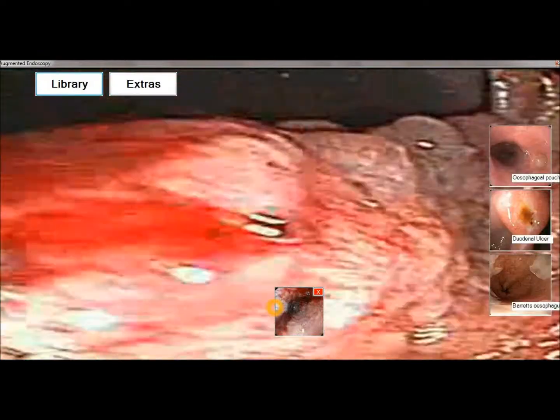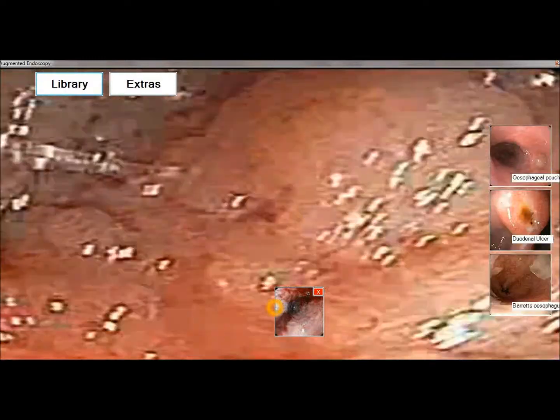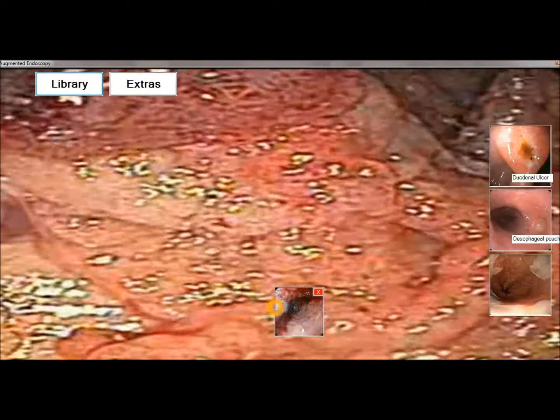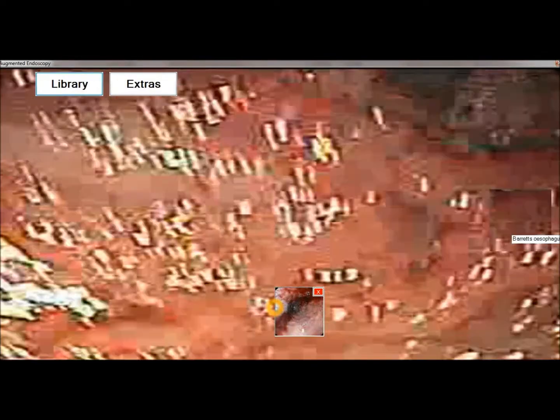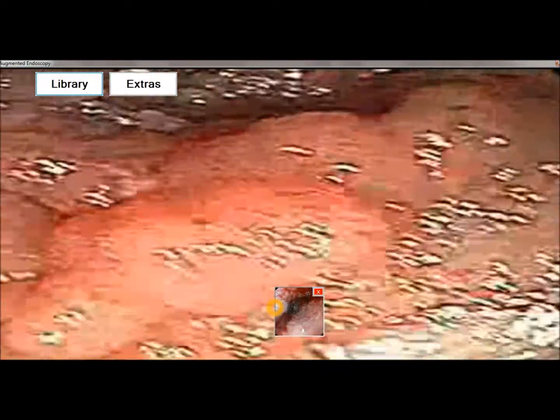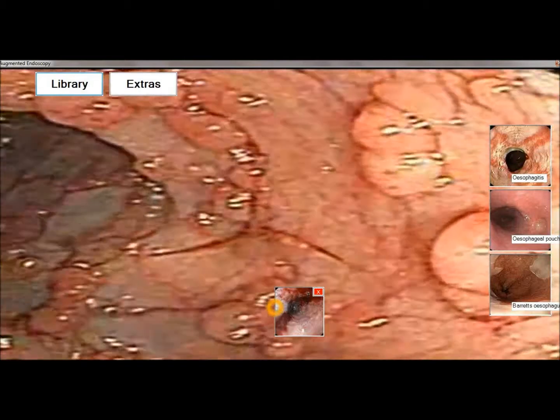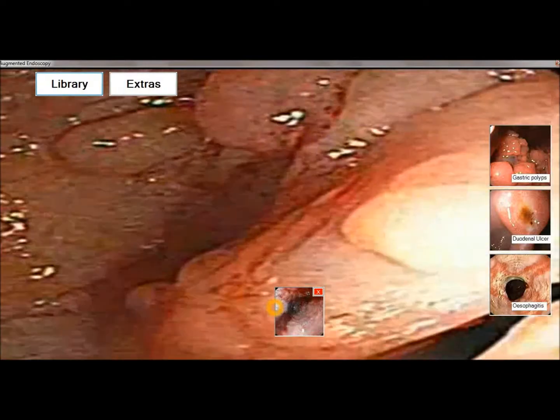The second technique I use is color histograms. This works by taking the entire screen, segmenting it into 100 squares, and at each square checking to see if the color histogram for that square matches a color histogram for an average healthy tissue. If it does, it's ignored. If it doesn't, it's added to a log. All of these damaged squares are then grouped, and the 2 largest groups are then processed to see if their average color histogram matches a color histogram already stored in the database.